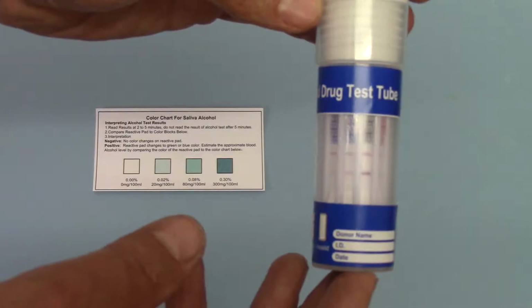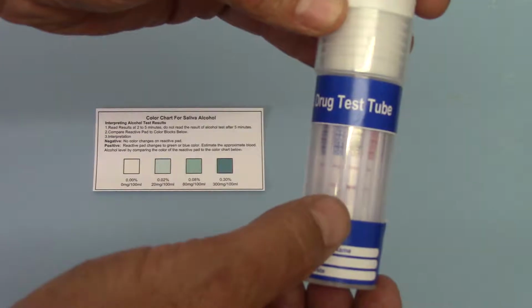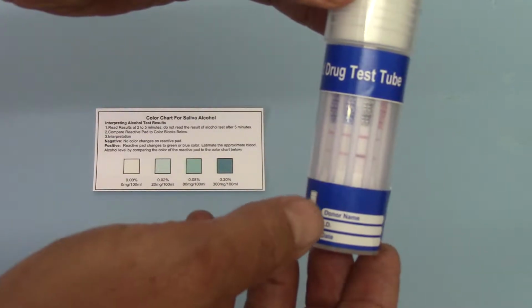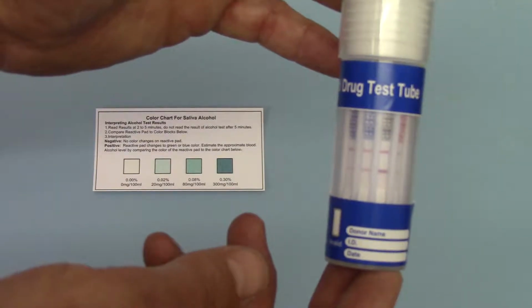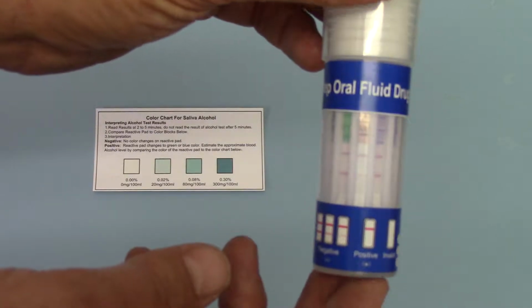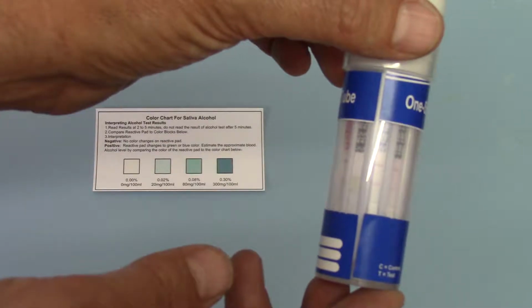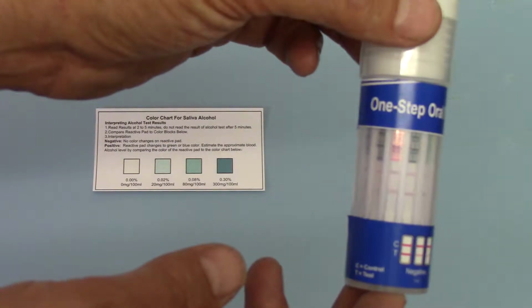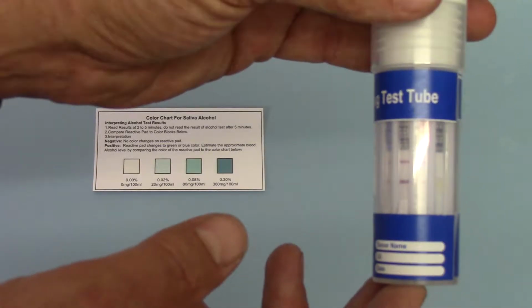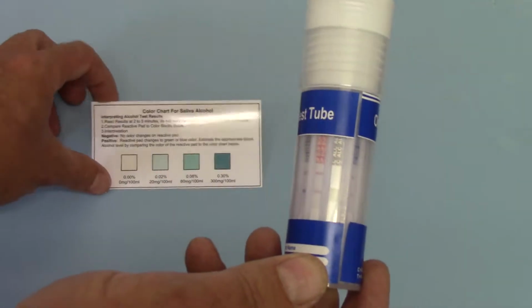Okay. Now, if we rotate these rounds, you will see a fair bit of variation. Just look at the difference in the colour density and saturation between that oxycodone result and the PCP next to it. That's because these are testing at very different sensitivities, and the membranes will give different results depending on how low particularly the sensitivity is for these drugs. But all those drug groups have a clear test line showing in the presence of the control line, so this is a completely negative result for all 11 drugs.